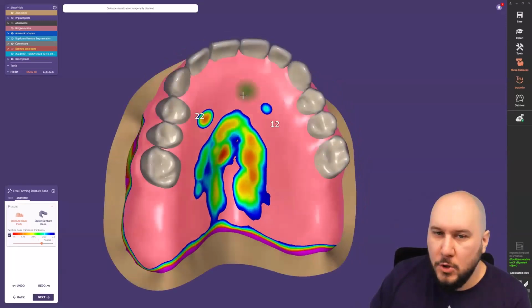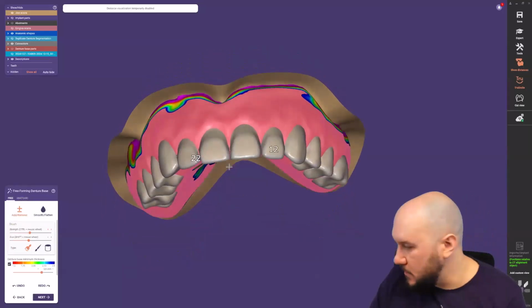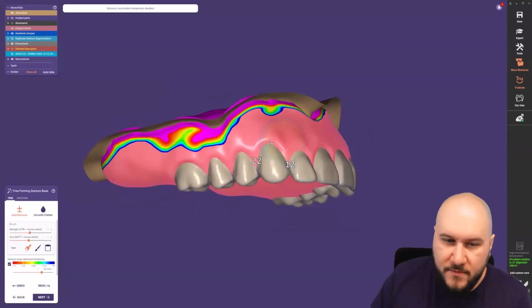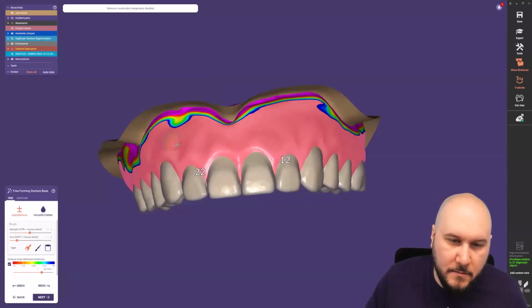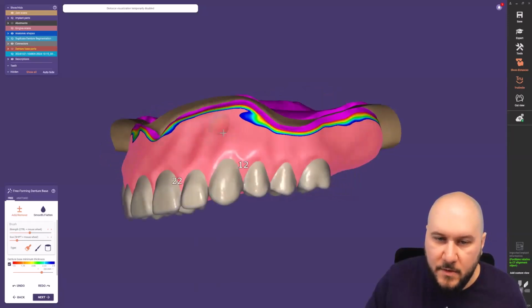Okay. Also here, I think freeforming will take place. And I will just check the clock. Okay, a couple of minutes left. Smooth and flatten. Everything is fine right away. I can just, for example, go here and make a marking, and give a little bit more or less, better design here, to have my alveoles a little bit more or less better.